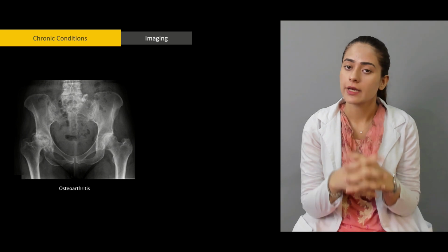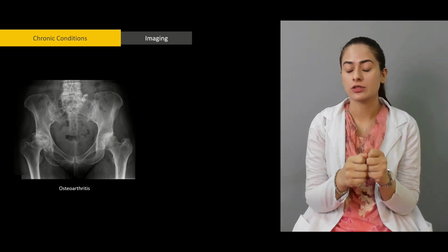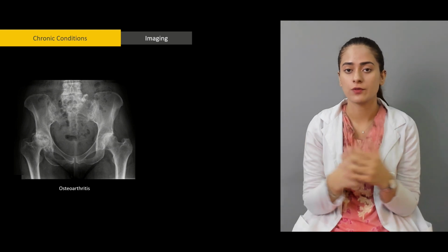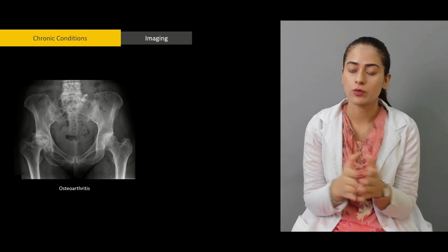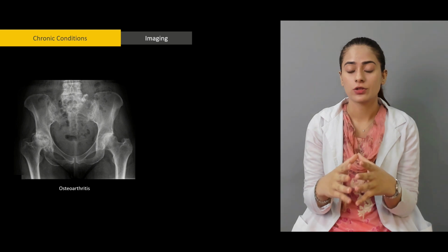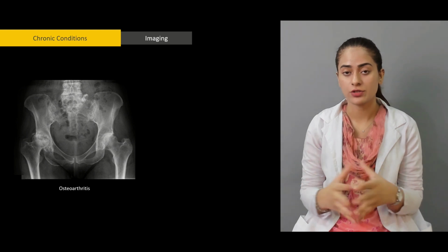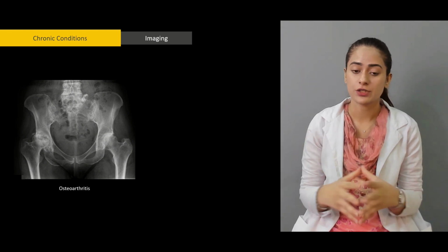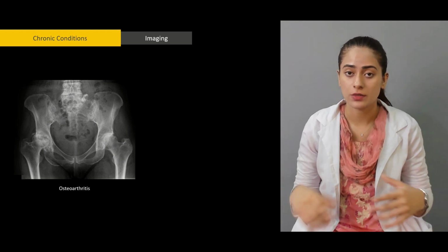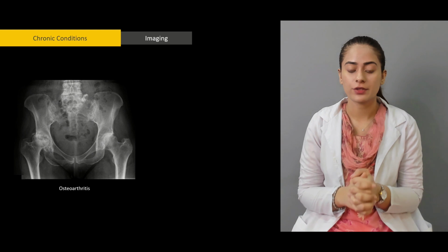Osteoarthritis has certain basic characteristics no matter which joint is involved. Those are the same here, like we discussed before in previous areas of the body. There's going to be decreased joint space, loss of cartilage, sclerosis, osteophyte formation, and loose cartilage bodies within the joint, which will result in a lot of friction, which will further progress the degenerative process and accelerate it altogether.